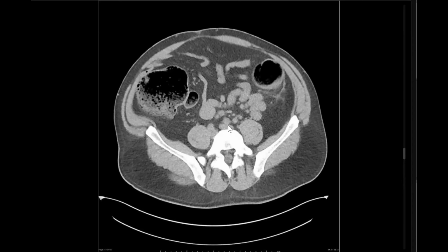Okay. Good point. What else? I would also add IV contrast to check for the enhancement of this dilated bowel loops and check for any complications. Like what? If there is venous thrombosis, because it looks like there is associated inflammation. I would like to assess the liver for any abscess or any lesion, or check for metastasis, for example. Yes, good. Check the portal vein for thrombosis and the liver for metastasis.